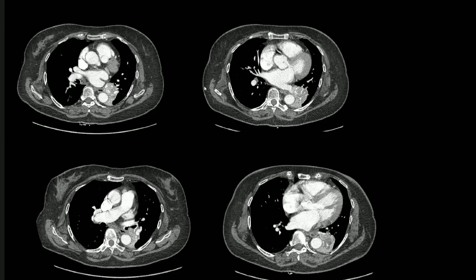And I can see a relatively hypodense mass over here, which seems to extend into the left lower lobe bronchus. That was the thing that we were seeing on the radiograph, right? Yes, sir. It seems to be extending into it, which is further causing distal collapse, atelectasis. Now we know that when the lung is collapsed, what is the enhancement pattern of a collapsed lung?